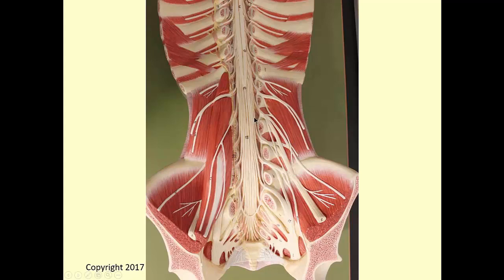Okay, anything else I want to say about that? This, of course, is super important, right? We've seen this in cadaver lab. That's the sciatic nerve, and it's formed by these anterior rami or ventral rami of L4, L5 form the lumbosacral trunk. S1 also blends into it as well. Oh, that's actually, sorry, oh my God. That's the femoral nerve. That's the big femoral nerve. Lateral femorocutaneous nerve. Meralgia paresthetica, if that thing gets compressed there. Remember that from Gross 1 and 2? Femoral nerve is right there. Anterior thigh pain, supplies the quadriceps.